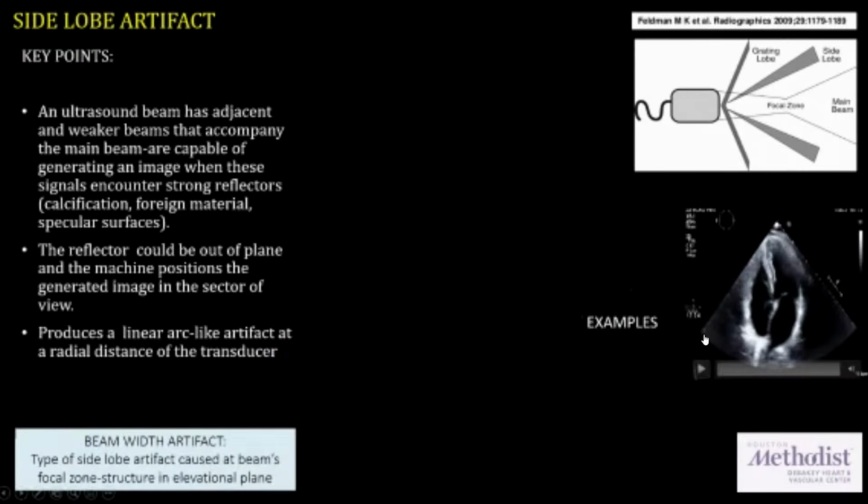And again, we actually see this one quite often. And this is nothing but a side lobe artifact from a dilated aorta. And we see this very commonly, and it's actually nothing but an elevational plane artifact.